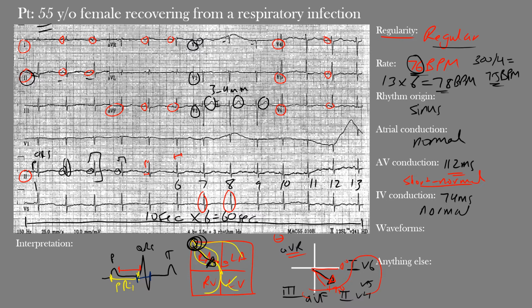So we showed the T waves here. You can somewhat see them here. Notice that you can see that there. Throughout the EKG, it's hard to make them out, so some, like I said, may consider that non-specific T wave changes. But really, it's normal in this case, so we're not going to be too concerned at this point.